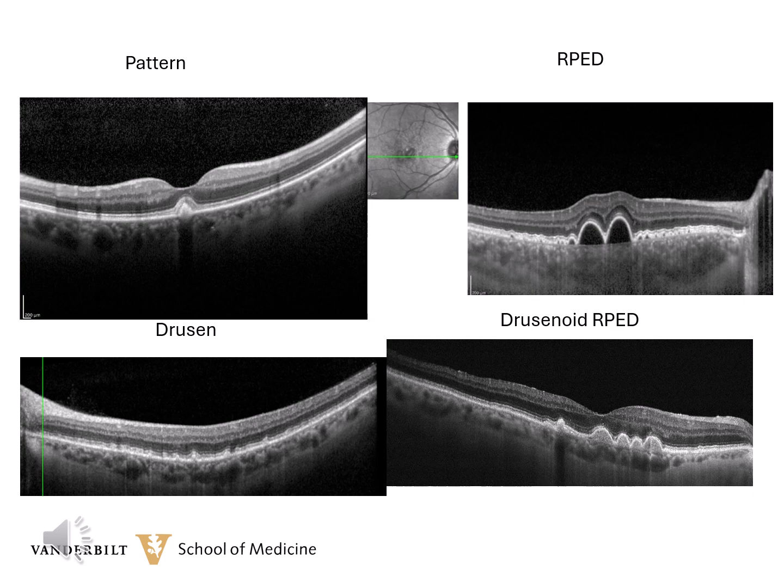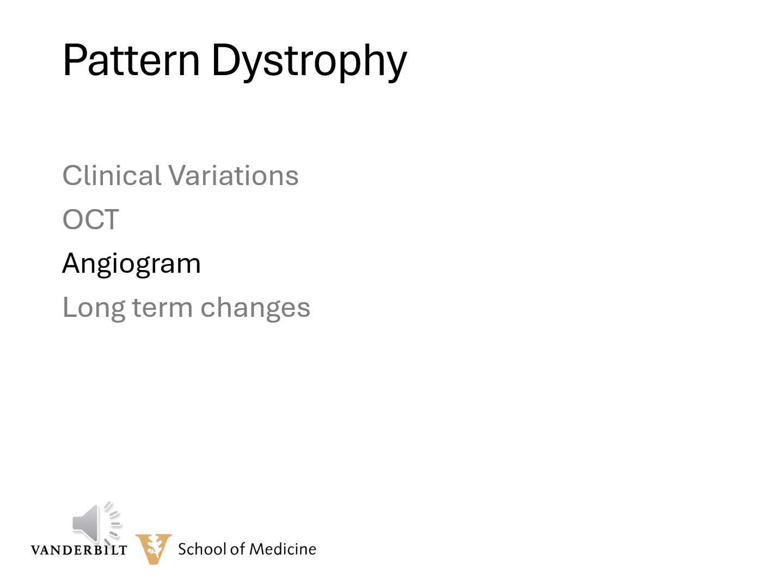The bottom left shows many small drusen. So again, those are sub-RPE. And the bottom right shows drusenoid pigment detachments. So here you have 4 different examples of pathology at that level of the retina, and I'm again showing this just for comparison. Now we'll go on to some examples of different angiographic findings in pattern dystrophy.